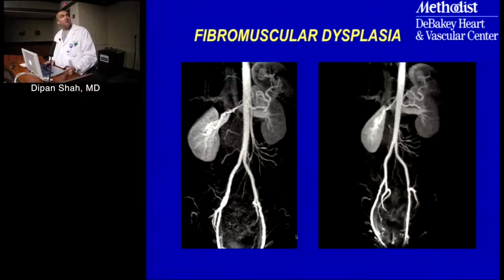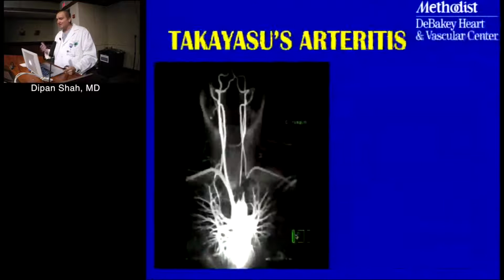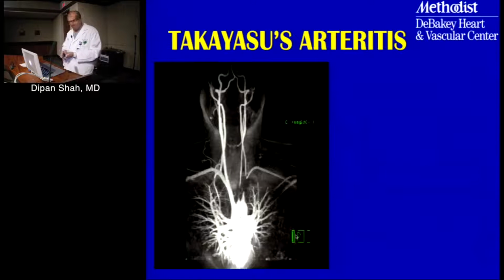So one of the things that you may come across, and again, a lot of these are pattern recognition. Here I actually gave away the diagnosis, but if you look at this, what do you see? So this is basically an arch and carotid study, okay?